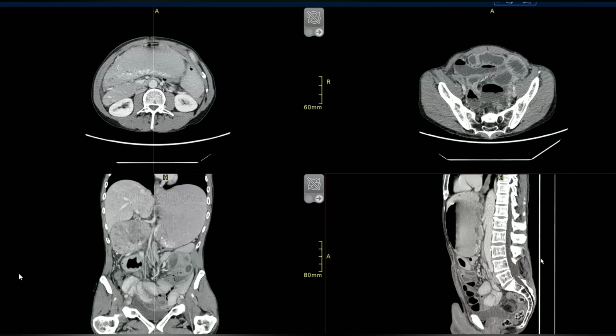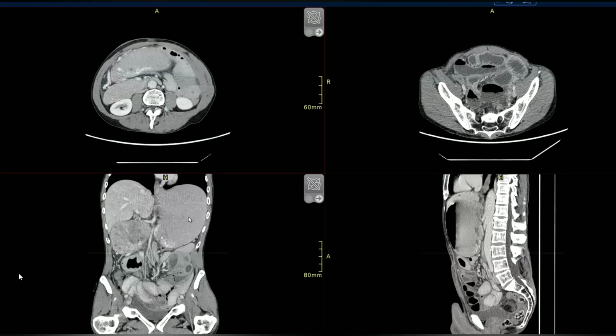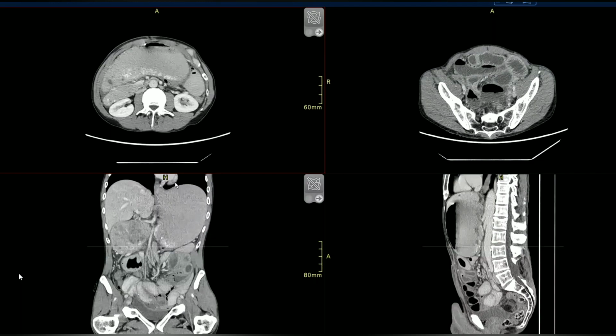It could be due to, it is associated with anorexia, malabsorption, congestive heart failure, other causes also. For this, this is what we suspected, and this was what it proved to be. NG decompression should be done for this, but you need to say that there's no ischemia and it's significantly distended. And then the bowel distal to the SMA, look at that.